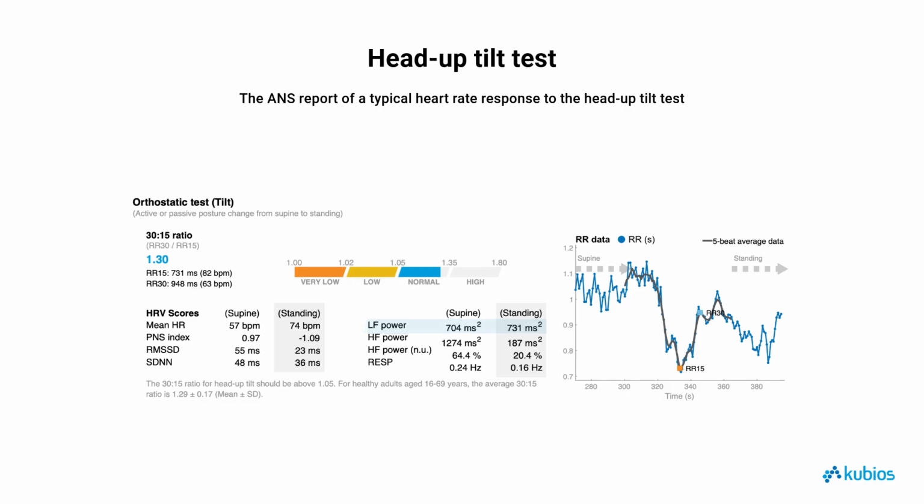Specifically, the low frequency, LF, and high frequency, HF, spectral components of HRV are valuable in assessing the shift in sympathovagal balance. However, it's essential to ensure that the respiratory rate is within the HF band, and the software's validated respiratory rate estimate is useful in this regard.